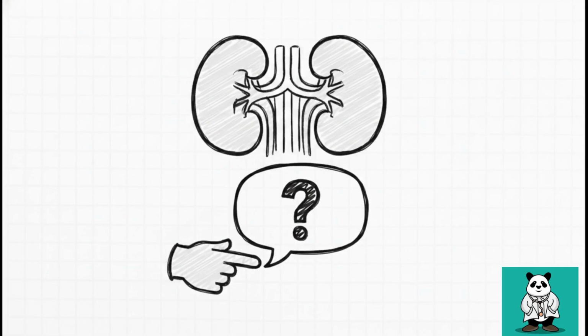So, the next time you're looking at an EKG, ask yourself, what is the U-wave silently trying to tell you before disaster strikes?